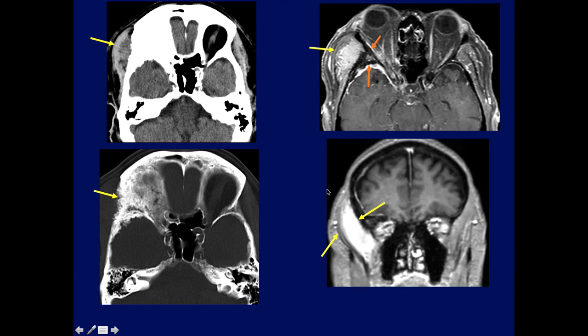It was an unusual case, again, of a pterional meningioma with marked expansion of the bone, but here the involvement was more lateral, and it grew into the temporalis muscle soft tissue and kind of broke through, presenting as an extra-axial mass. And note the erosion of the bone here, the frontal bone and the sphenoid, by this meningioma. Look at the tremendous thickening of the temporalis muscle here.